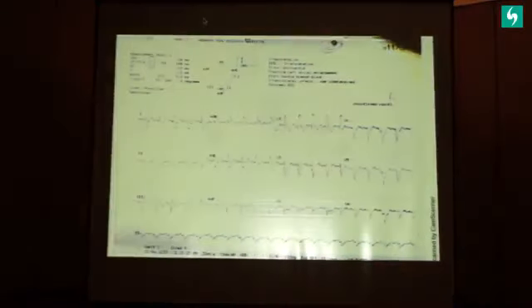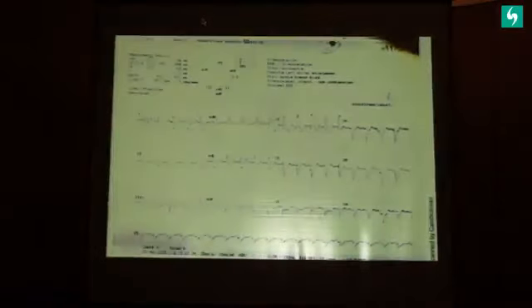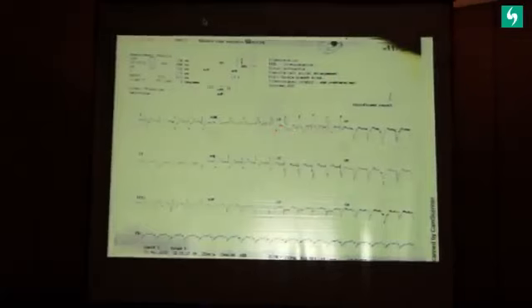Now this is the ECG of this patient. As we dwell further, we learn. However, this did not come to the notice until the troponin value came in. So this was the ECG, which gives you a lot of clues. You see V1, there is a right bundle branch block pattern. This T wave is inverted, which is fair enough. There is an R prime, so you expect this T wave to be inverted. You would see lead 2, 3, aVF show a pattern of a QS complex and then an R.